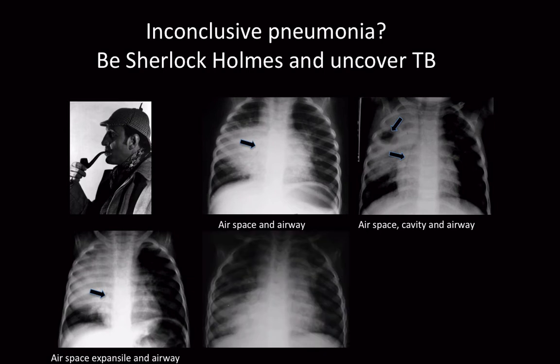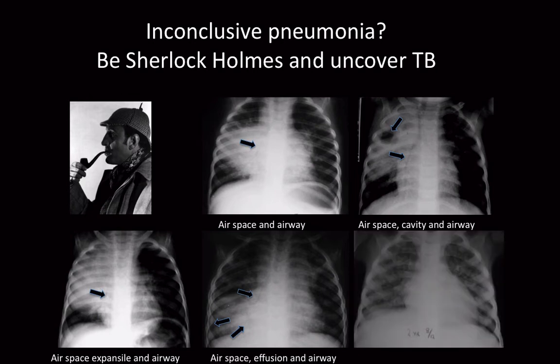One more thing, patient with lots wrong with him. There's an effusion tracking up the side, a lamellar effusion. There's airspace disease. You can't see the right cardiac margin. And look through the density. There's your compression.